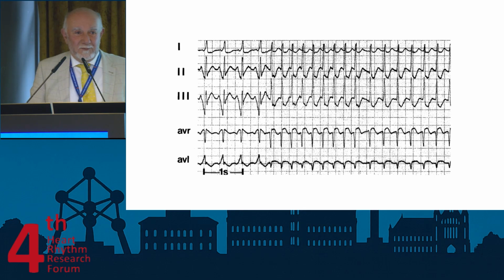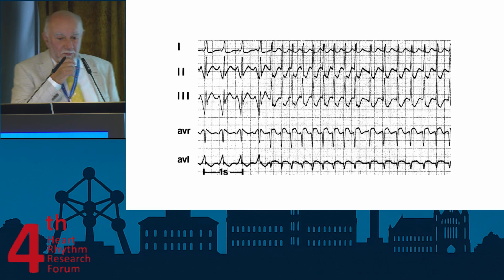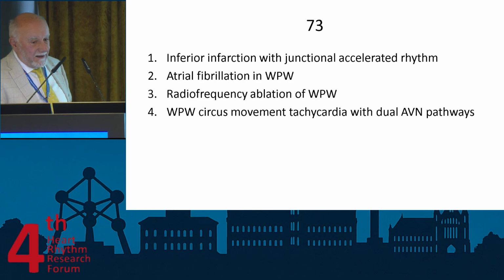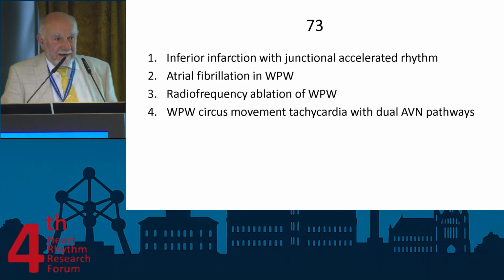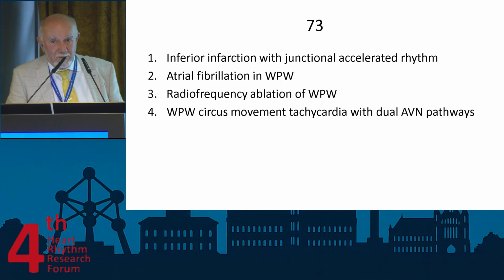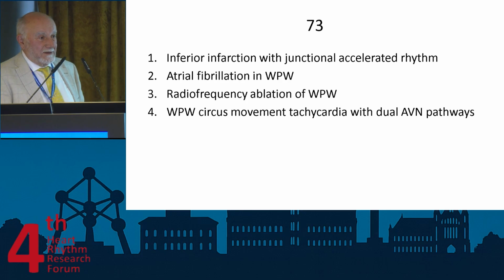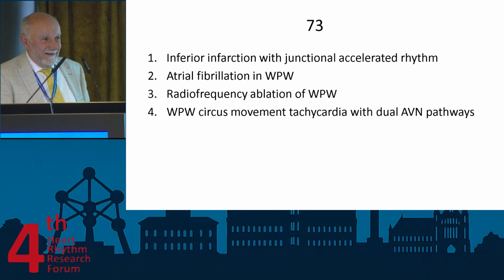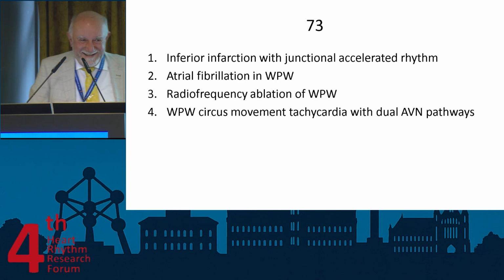Number one. Who votes for one? Inferior wall infarction with junctional accelerated rhythm, atrial fibrillation in WPW, a patient in whom we are performing an ablation of WPW at that time, or is that circus movement tachycardia with dual AV nodal pathway? 4, definitely 4. Yeah, definitely 4.